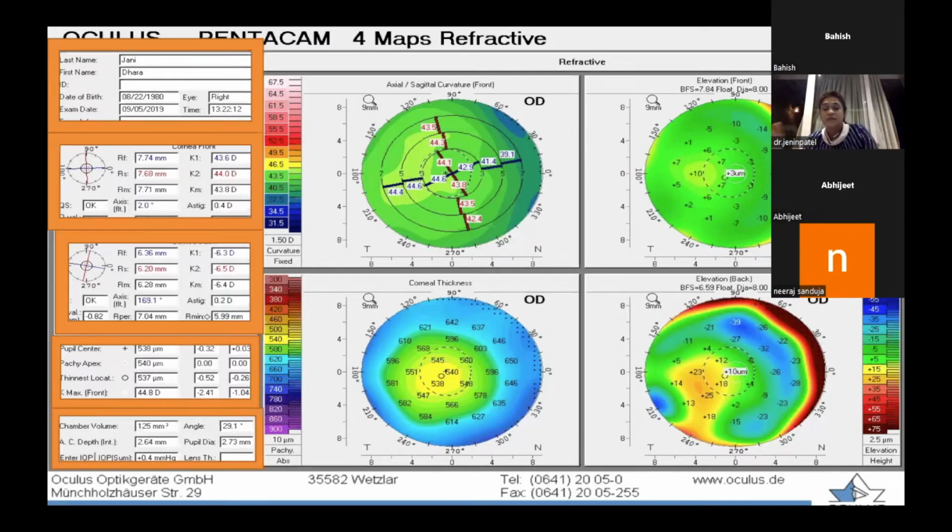No, I'm talking of the minus and the plus signs. Will it differ for the left and the right eye? No, the minus and the plus signs are not different. There will be a minus and the plus sign in both the eyes.